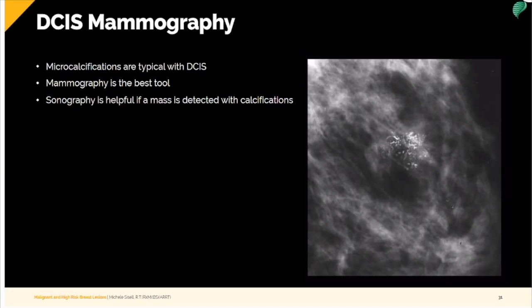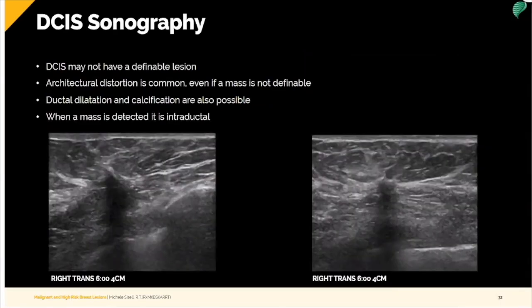Sonographically, calcifications cannot be seen unless they are large, within a solid mass, or are causing shadowing, which may occur when they're in a tight group pattern like you see in this image. Calcifications are usually not sent to ultrasound for further workup, but if the radiologist feels there may be a solid component associated with that calcification group, ultrasound may be ordered.